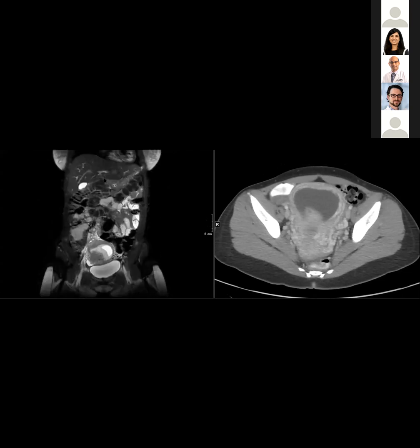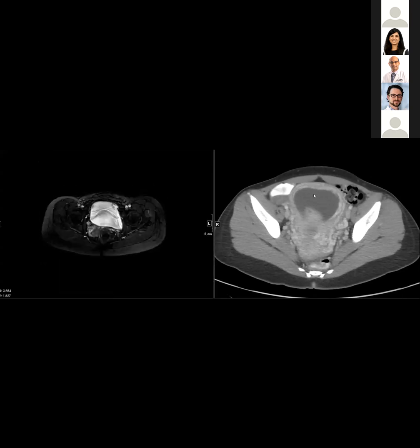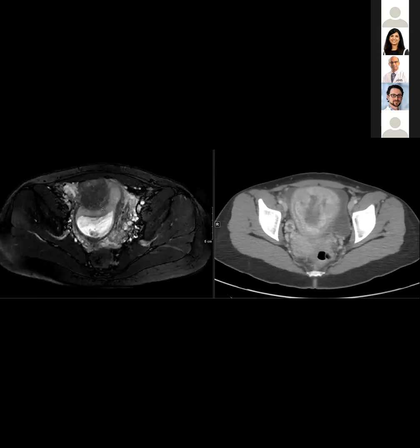I feel like, sometimes, and it's also, there's a pregnancy there. Do you have arterial phase on the axials? No, this is it. You know, it's always like this. This was obviously done just for an appendicitis situation.